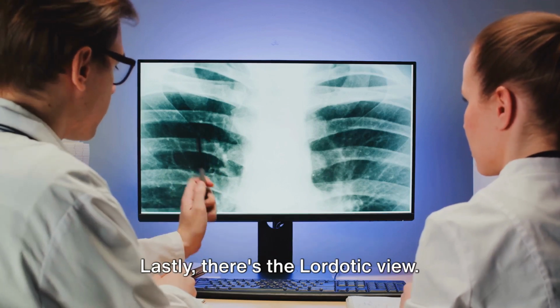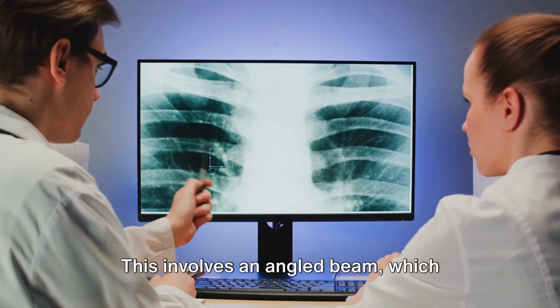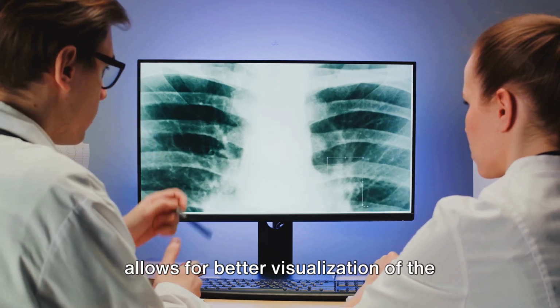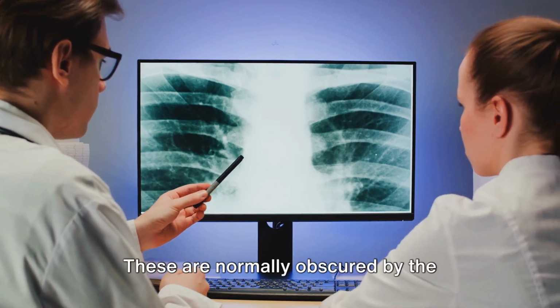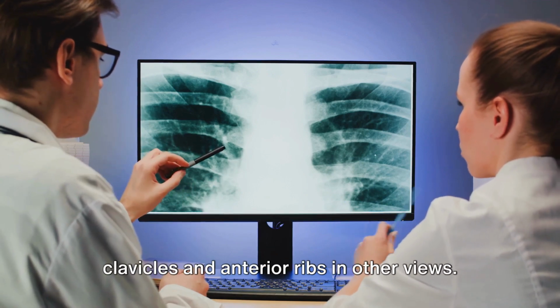Lastly, there's the Lordotic view. This involves an angled beam, which allows for better visualization of the apices, or the pointed ends of the lungs. These are normally obscured by the clavicles and anterior ribs in other views.